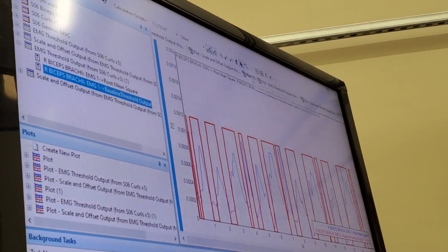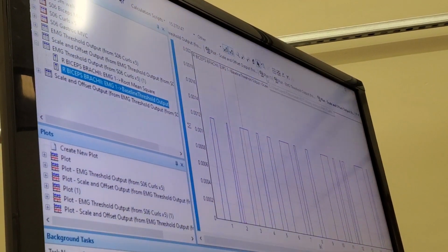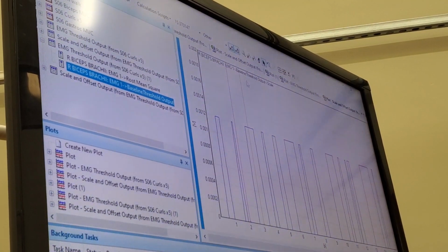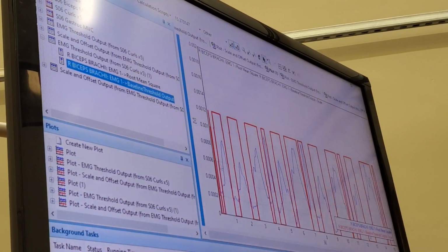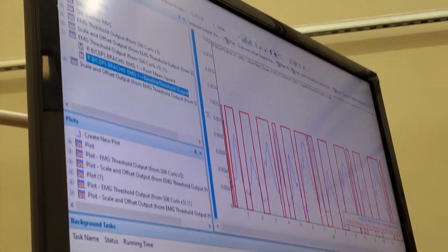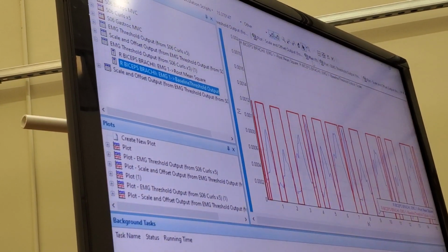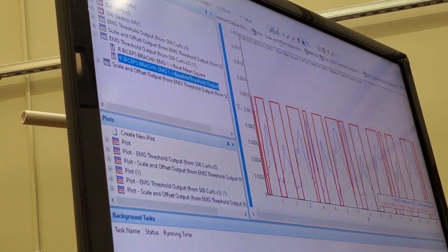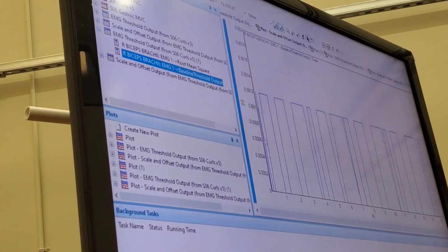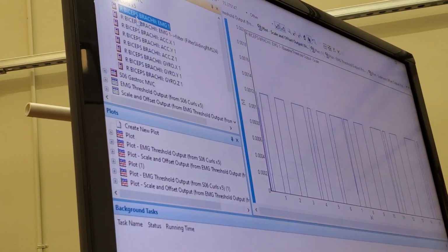Let's see. So it eliminates a little bit, it eliminates the initial spike. It looks like that's the only thing that it actually does there. So that increased the threshold that is needed to detect that the muscle is on, basically. And that initial spike here wasn't really enough if we increase the baseline threshold.